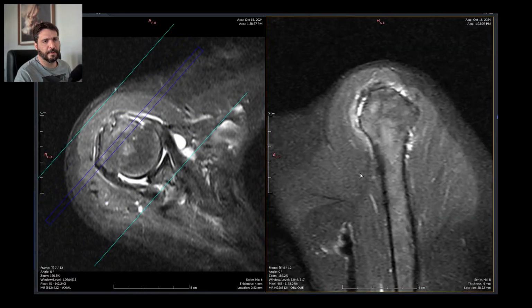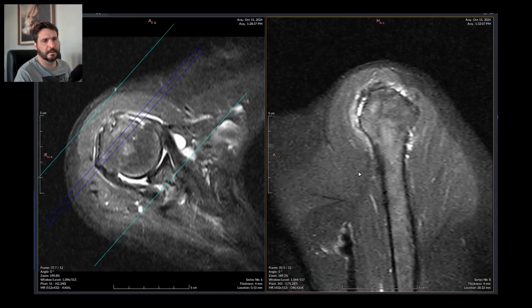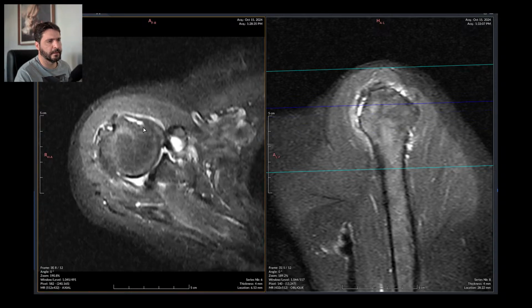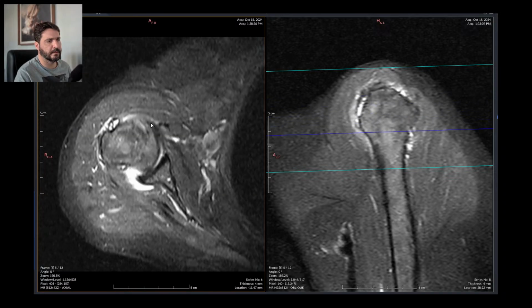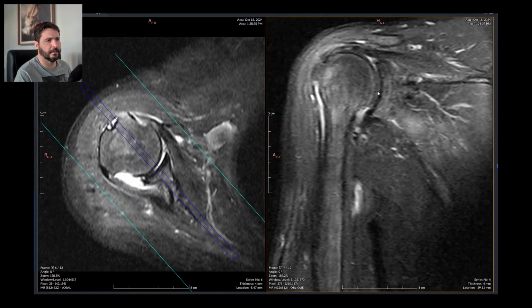It seems to be partially ruptured too. Yes, it is right there. Its tip is ruptured. It goes well until this place and then it goes bad. Now let's see if I can see it here.